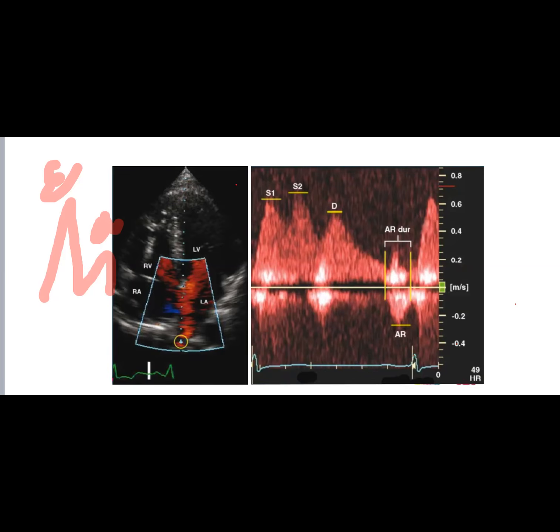If AR minus A duration is more than 30, when we are talking about milliseconds, okay? Yes, that is significant. It indicates elevated LVEDP, and the longer this duration, the higher the LVEDP. Okay? This is when you are integrative. Now you are incorporating two signals together. The AR from the pulmonary venous Doppler on one side, and the A of the mitral inflow from the other side. Good?